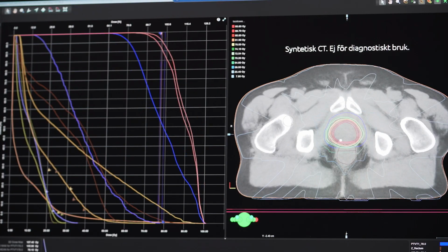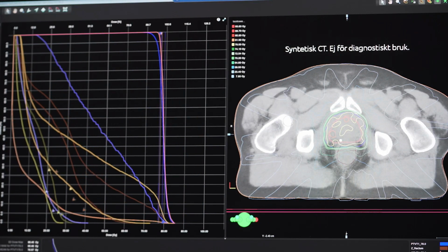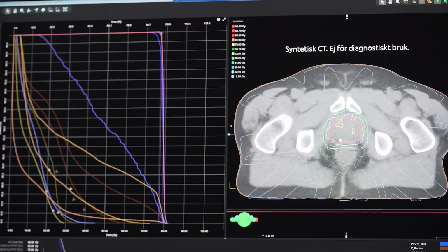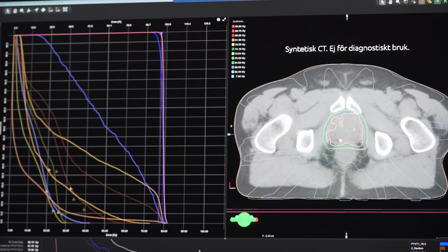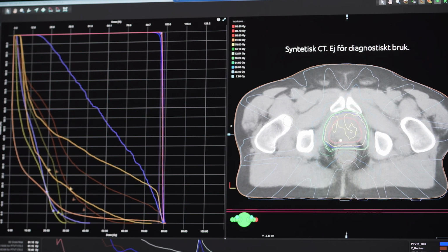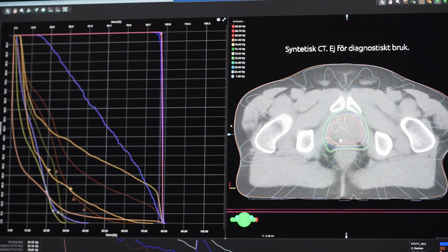Once all your delineations are in place, creation of the treatment plan and optimization are performed using the same clinical criteria as you would use in a conventional CT-based workflow. The procedure works equally well regardless if you're creating an IMRT or VMAT treatment plan. Once your treatment planning is complete, clinical QA routine follows as usual.